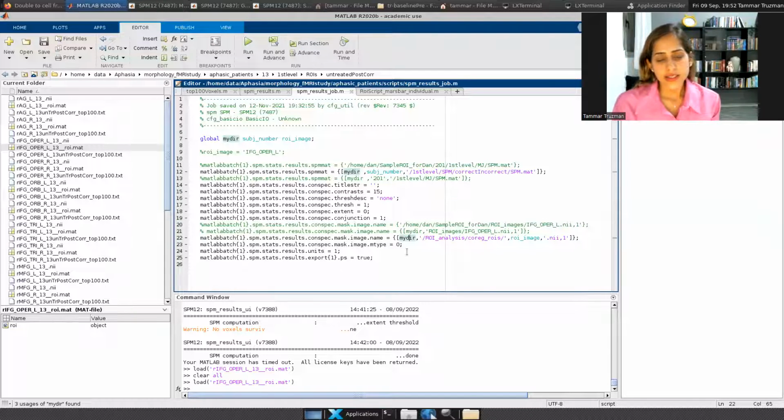As you can see, it is running for all of the ROIs at the same time and all of your subjects, but only one contrast at a time. I believe if you really want to, you can create a loop for running this across the different contrasts. After you're done, as I've said, you have text files and .mat files for each subject, for each ROI, containing the top 100 activated voxels within each ROI and contrast.